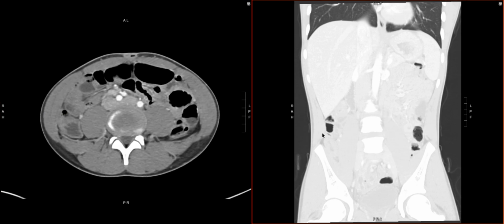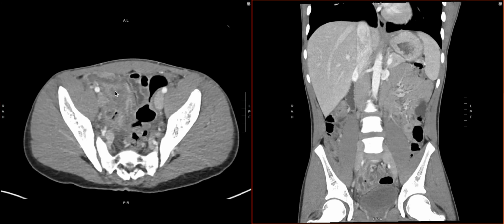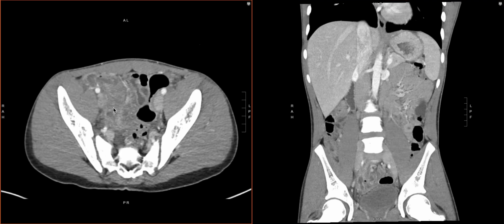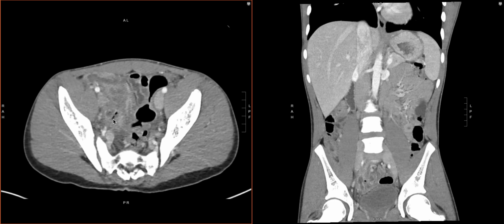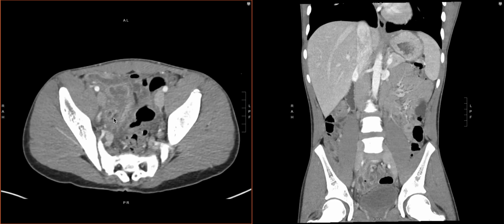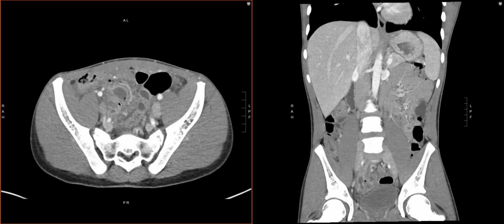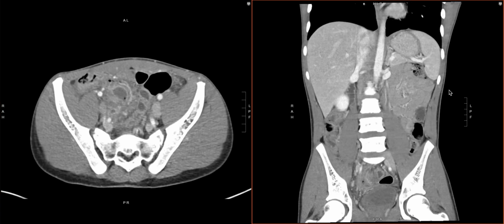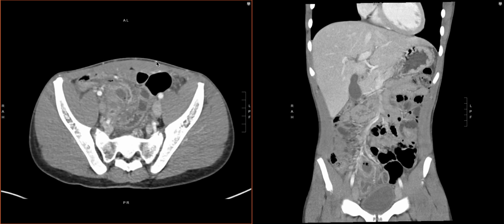And then what we can do is go back and look for free fluid on our soft tissue window. And again, we've already identified this area. Wouldn't necessarily say this is a large enough collection to drain, but there is a little bit of semi-contained or contained free fluid here, maybe a small developing abscess. But then when we come up here, we see that this actually does not connect to any bowel directly. At a glance, it may look like a loop of bowel with gas in it, but this is actually an organized fluid collection, an abscess.